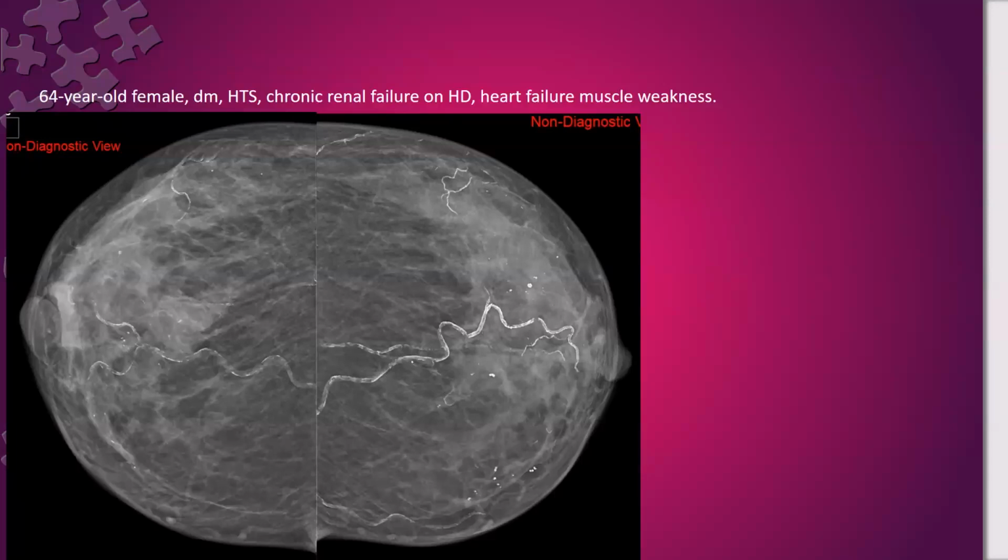Okay, so you have to look carefully. You have to look in this case. Is this patient specific? Yes. Look for the history first. So the patient has chronic renal failure. Both breasts, edematous. Bilateral edematous. Demonstrate some edema, but nothing else. Nothing is there.